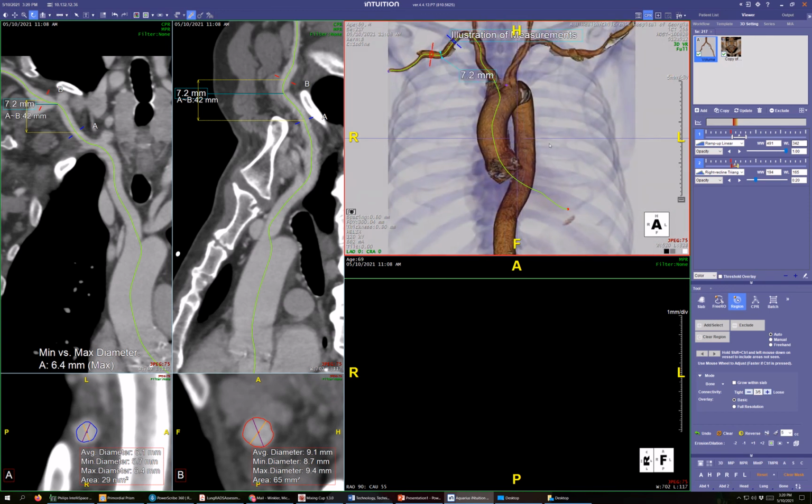It samples across the screen parallel to the bottom at every subvoxel point along the line, and then it places each of those samples incrementally along here to make this picture. So if the green line is traveling from bottom to top, it comes up with essentially a coronal. But if it moves off to the side or backward or forward, then you get mirror image artifacts because it's sampling up and then sampling down through the same territory. And it ends up longer than the original thing, which is why it's called a stretched curved planar reformat.